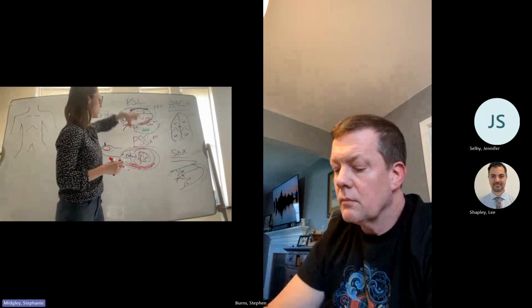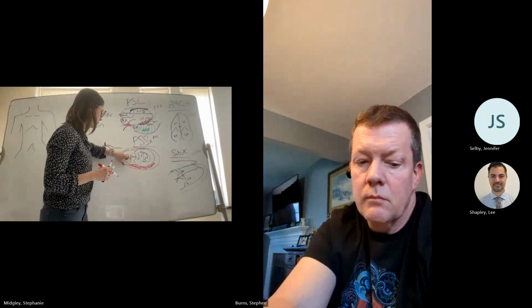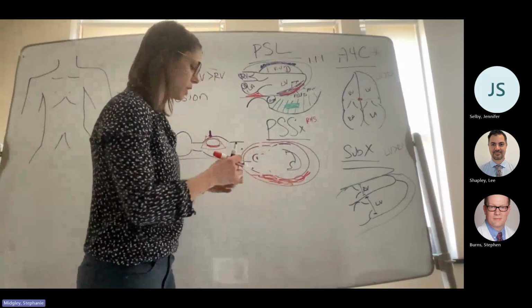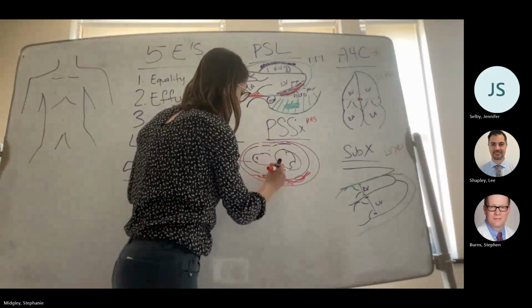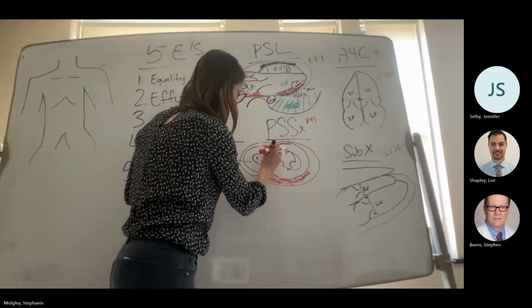There's so much less stuff going on that it's really easy just to see effusion. Whereas like this one, there's just so many things going on. I feel like it's easy to miss it. All right.